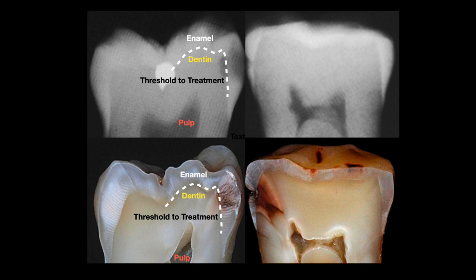I'm excited to bring to you a video that you never really see anywhere else. And that is going over an image of an x-ray and what it looks like in the mouth as well from the same angle. These images were taken from a journal article examining the depth of cavities, and that's why they have these images. So what they did was that they took the x-ray first and then they cut the tooth in half to show what the cavity looks like inside.